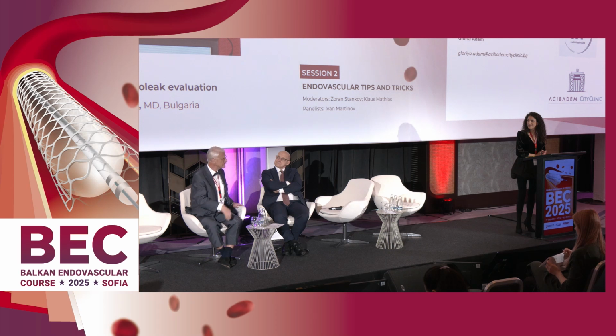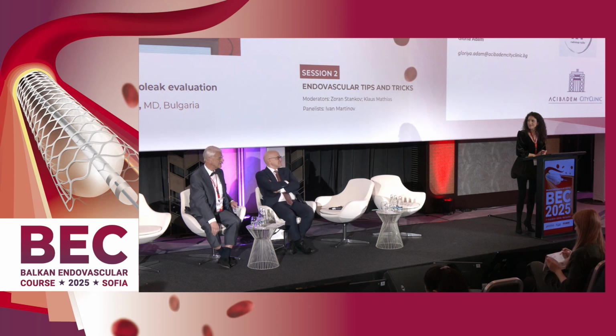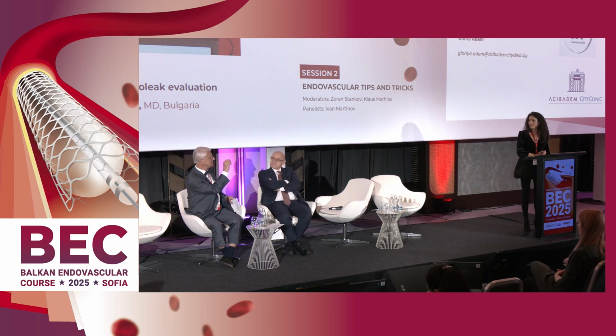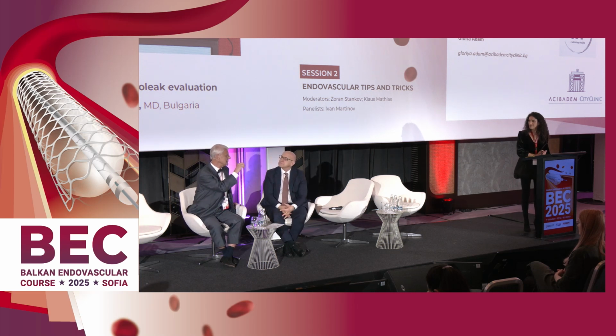I don't know if you have ever done that, but in some cases it's helpful when you have no other way to find the feeding artery. A tip. Yes, it must be at least, otherwise you cannot puncture it. Yes, but under CT guidance, it worked well.